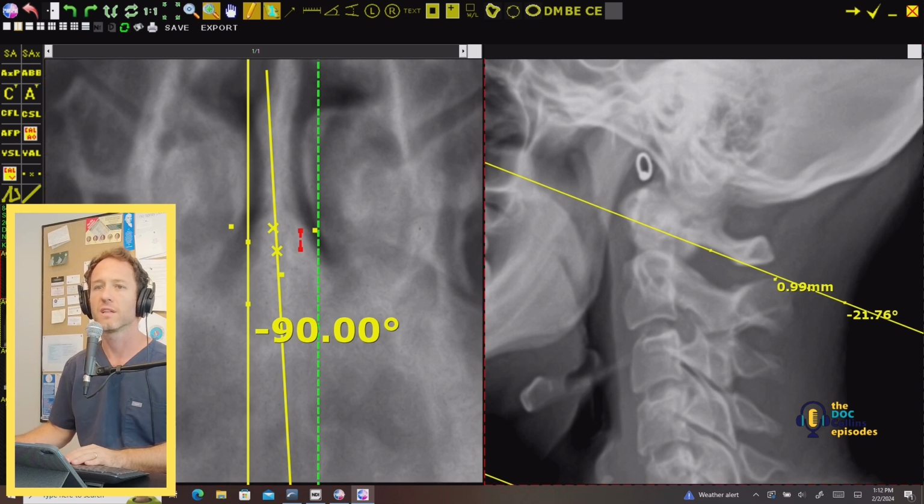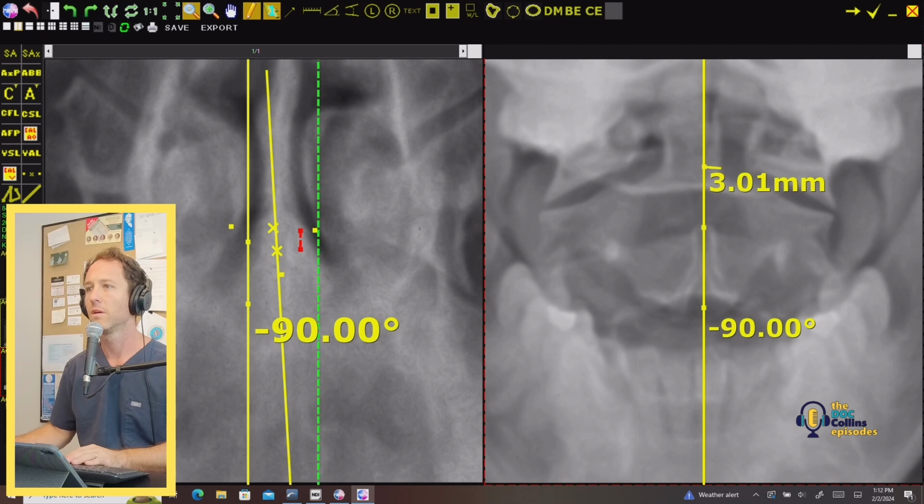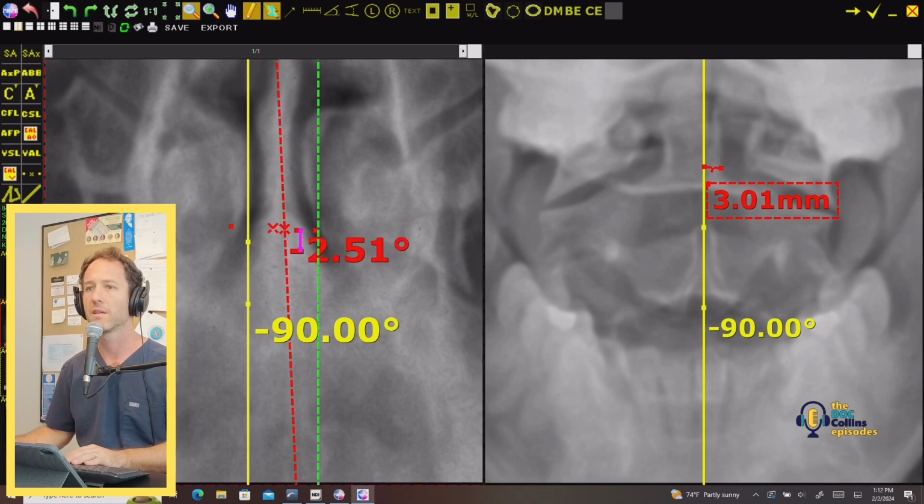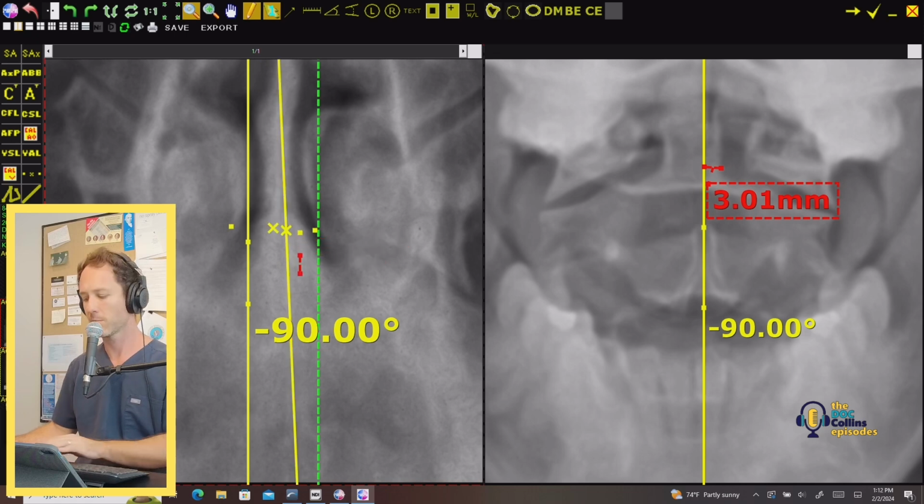And then rotationally, if I toggle back to my axial view, it should give me a sense rotationally, you know, where it should be as well. So if for some reason I just have a really hard time seeing this, dimensional transpositioning is a blessing, right? So feeling comfortable that that's where my C2 mark's going to go. C2's tip of the spinous process.